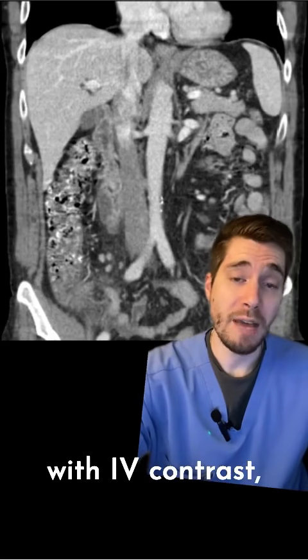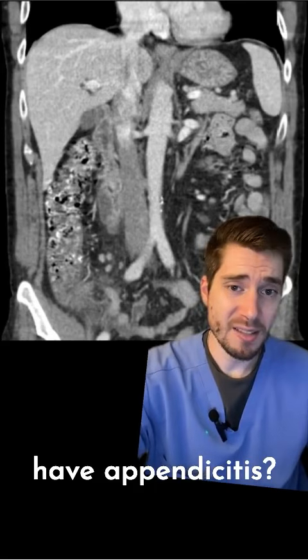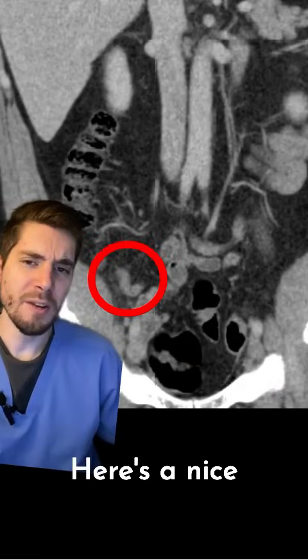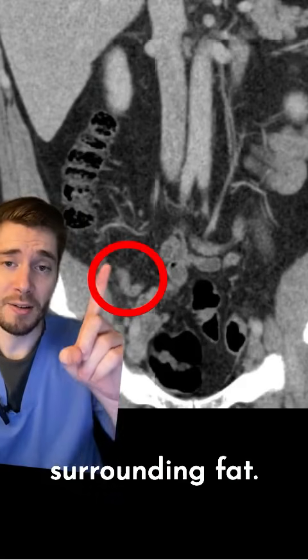We order our CT with IV contrast, and here are the images. Does this patient have appendicitis? Do they need a surgical consult? Let's look at a normal appendix first. Here's a nice normal appendix. It's not dilated, it's tubular, and it has nice dark surrounding fat.